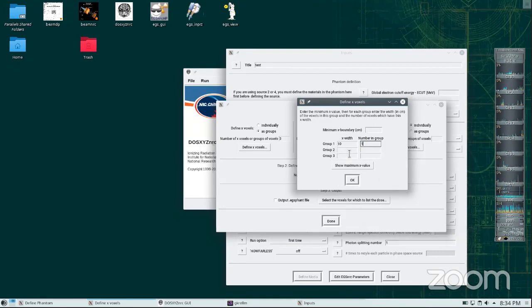And here, let's put 20, 30, 40, let's put 80. And here let's put 0.25. Sorry, the opposite, this is 80, and this is 0.25. And then I'm going to put 10 and 1.